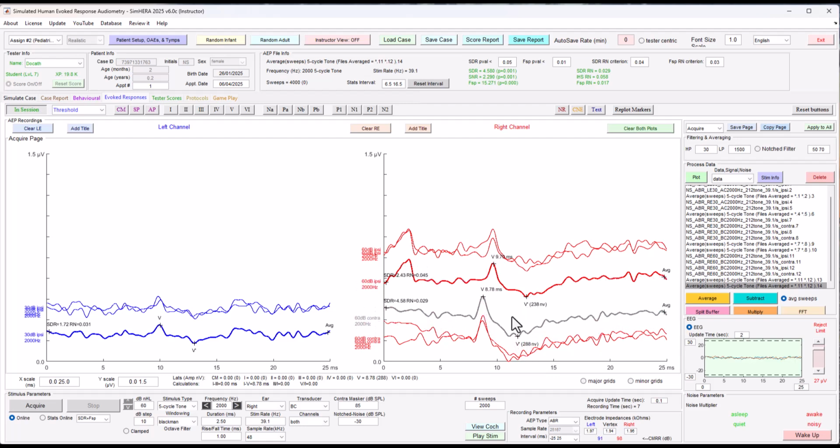So this gets an inconclusive result of judging whether or not the ipsilateral cochlea is responding, because we are unsure if there is an ipsilateral response underlying what looks like contralateral activation from the contralateral cochlea. So that masking is going to hopefully help reduce that. But this is how we make our judgment. Okay, so let me just label these.